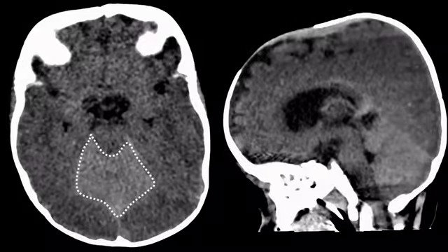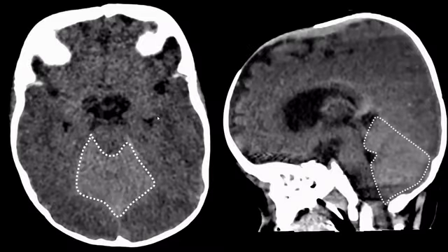Now, I think nowadays this sign is not that important anymore. The quality of CT scanners is so good that we can recognize a diffuse brain edema. But in older times, when image quality was different and there was no option to generate reconstructions of the coronal or sagittal plane, the distinction between the bright cerebellum on the axial plane and the surrounding hypodense supratentorial brain parenchyma could probably be useful to suggest the diagnosis of diffuse brain edema.